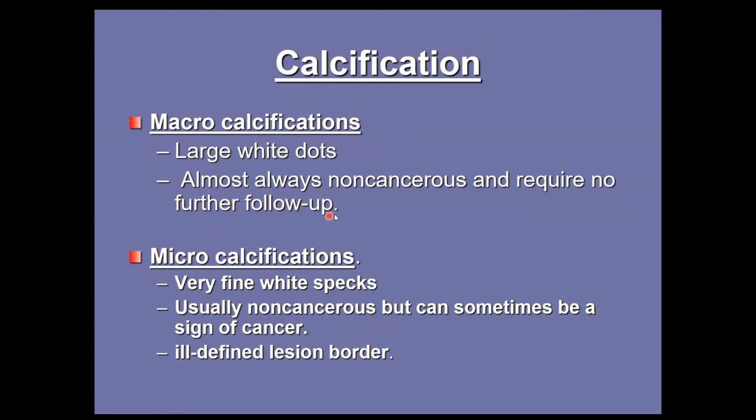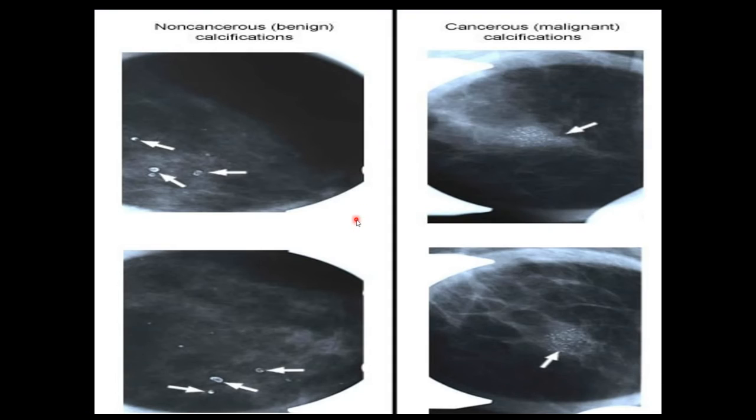Especially fibroadenomas show calcifications, with the typical presentation being popcorn-like calcifications. They are benign tumors, and we can perform biopsy for diagnosis. So these are big calcifications.